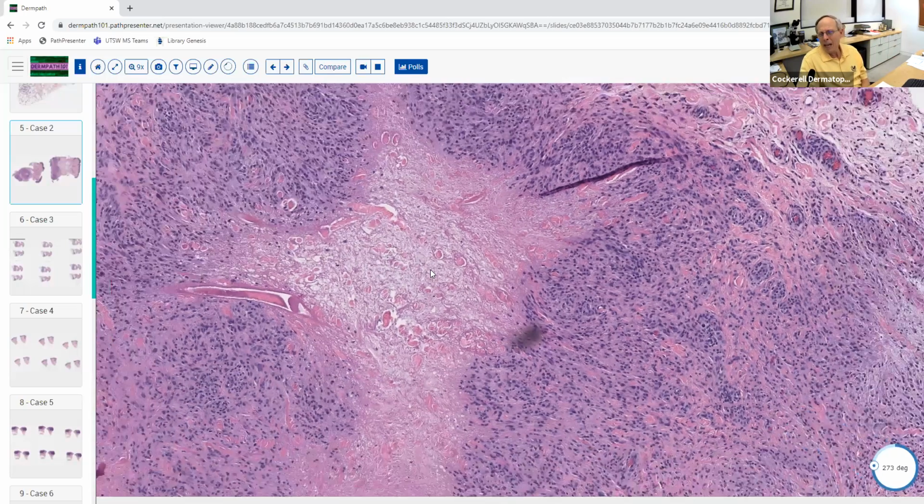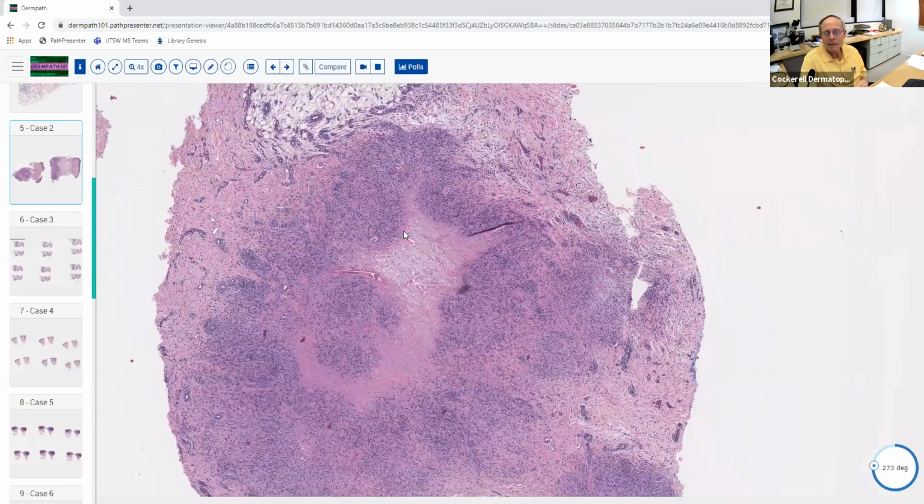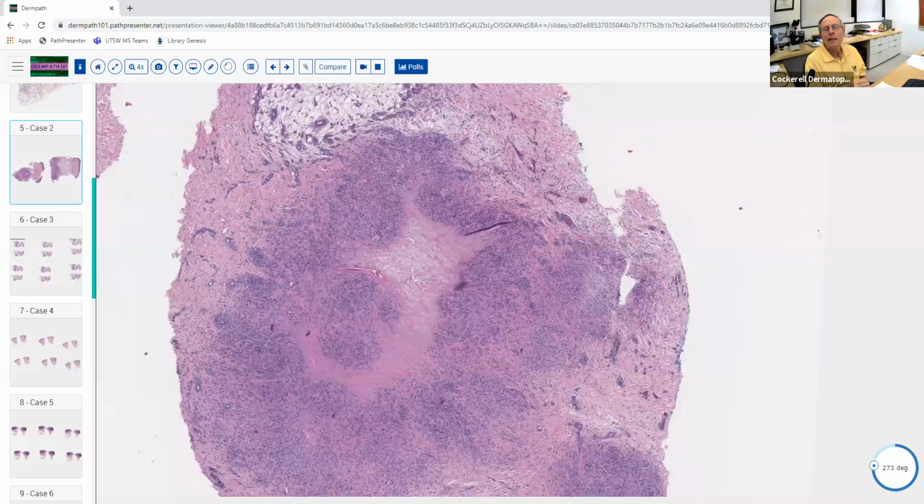And then usually the pattern of NLD is not really like this, so that really doesn't come into the differential diagnosis. What's the pattern of NLD when we look at that histologically? Does it look like a subcutaneous nodule like this? No, it's like the layered cake. Exactly. It's kind of a diffuse granulomatous pattern that involves the dermis, and you get plasma cells. It does look like granulomas alternating with collagen bundles that are degenerated from top to bottom and side to side. So it really doesn't ever give you the pattern. Even though that's in the classic differential diagnosis of palisaded granulomatous dermatitis, it doesn't give you a nodule like this.